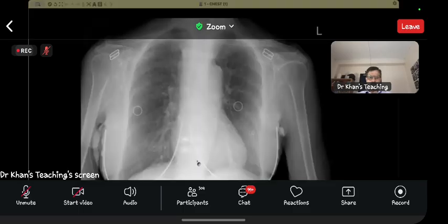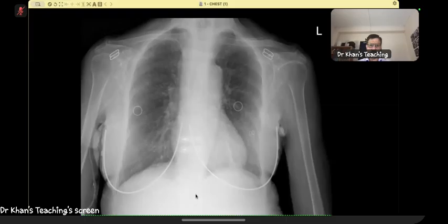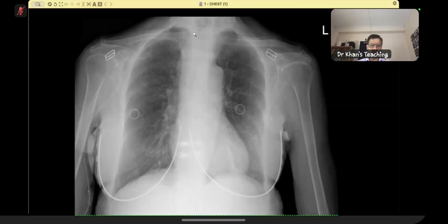Thank you. Very well done. So in this particular case, I was so happy. The candidate immediately picked up something, and because of that, he immediately went on the right track, which was that there was no bubble here. Now, if you look carefully, I had to do a bit of prompting here, but maybe you had seen the finding and you could have described it.